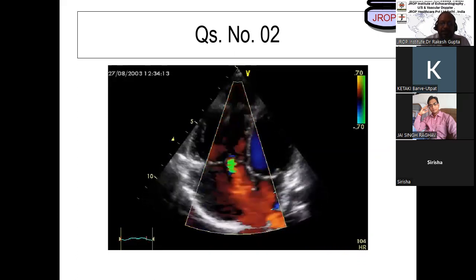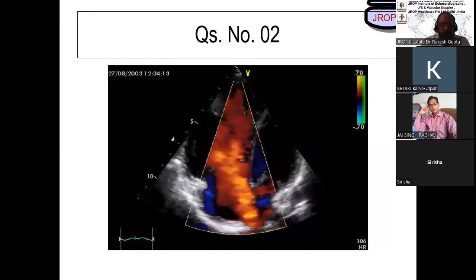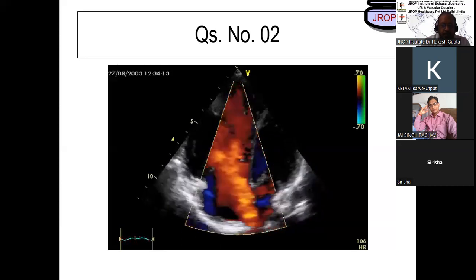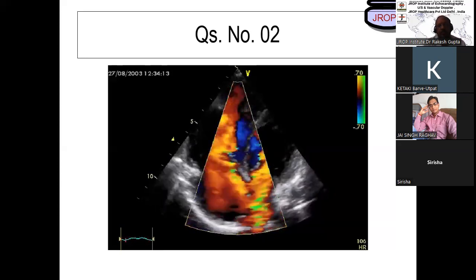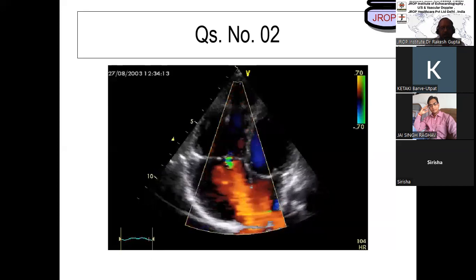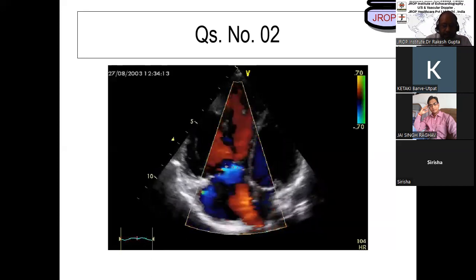Why did you say this atrial septal defect is present? Sir, right pulmonary vein flow is flowing from LA side to RA, flow towards the probe is showing as a red flow, and plus there is tricuspid regurgitation also with RA-RV dilatation. Okay. Suppose this is an artifact. How will you say with confidence that this is definitely ASD? ASD generally has RA-RV dilatation. Correct.